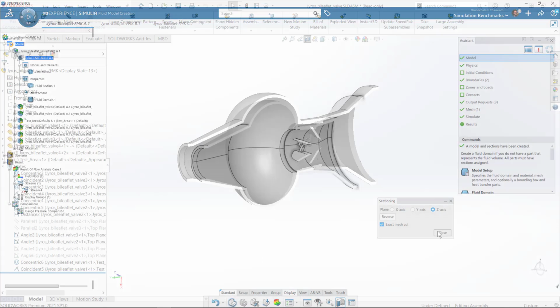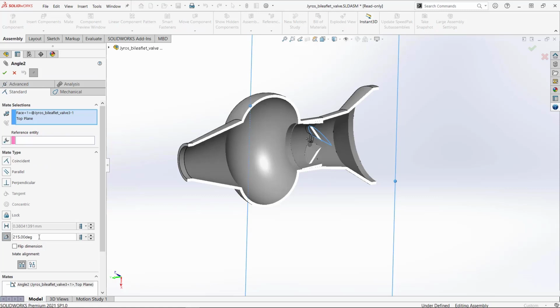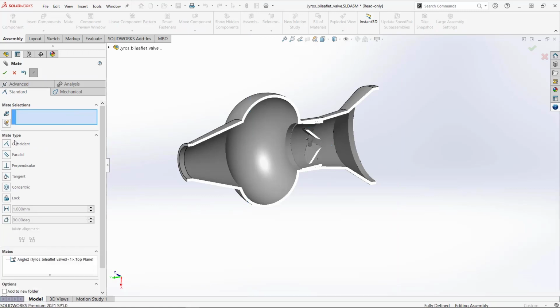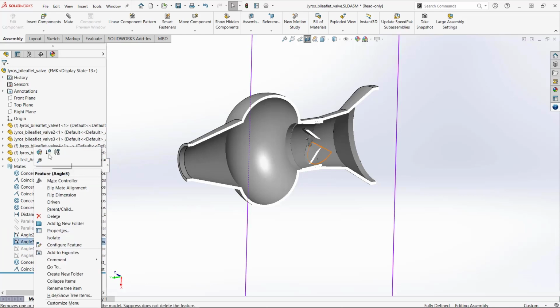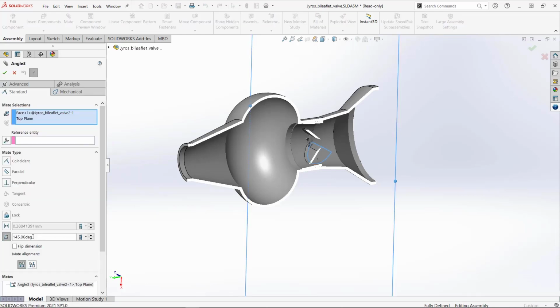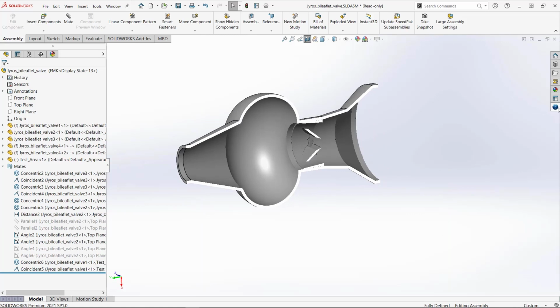Now, I'd like to show you on the next slide how I was able to drive the design change. I can drive this design change directly from SolidWorks, which is the biggest benefit of using this 3DEXPERIENCE technology. So here I have the heart valve design in SolidWorks, and what I'm about to do is modify the mates of the leaflets, so I reposition their angle. Once I've modified both these mates, I can use the 3DEXPERIENCE connector to essentially push these design changes onto the simulation environment.